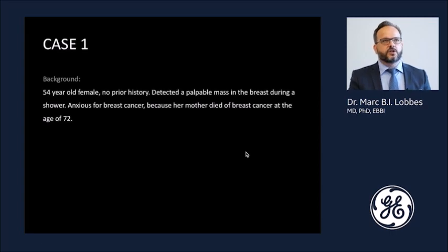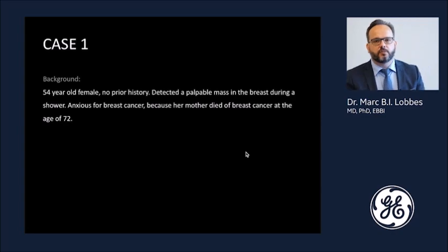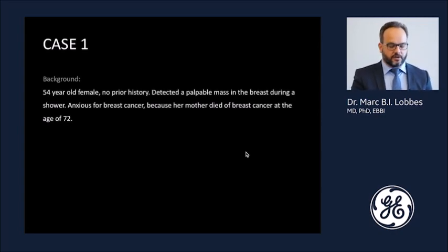I want to touch on several things regarding contrast-enhanced mammography based on a handful of cases that I want to show you. In this case, which is from clinical practice, we had a 54-year-old female without any relevant prior history. She detected a palpable mass in the breast during a shower, something which occurs very frequently. She's very anxious for breast cancer because her mother died of breast cancer at a rather high age.